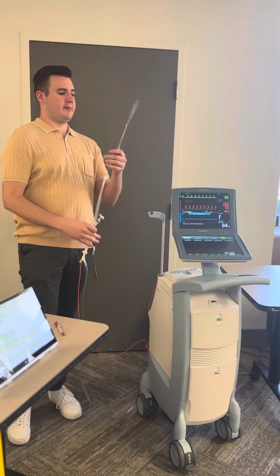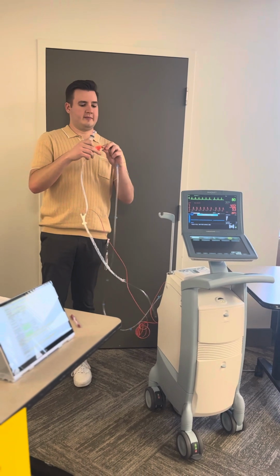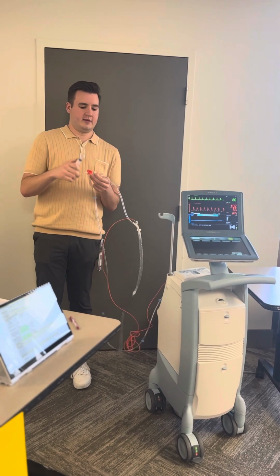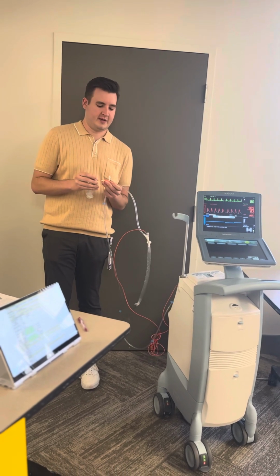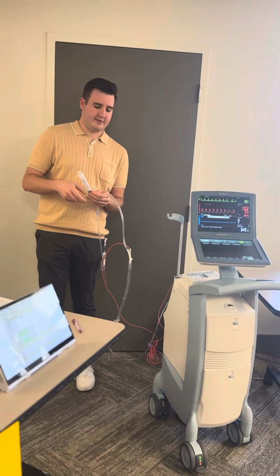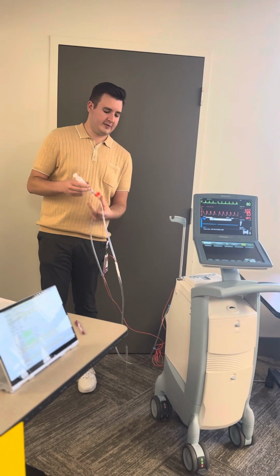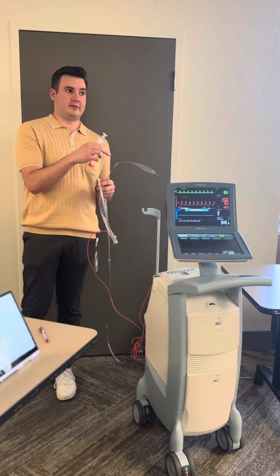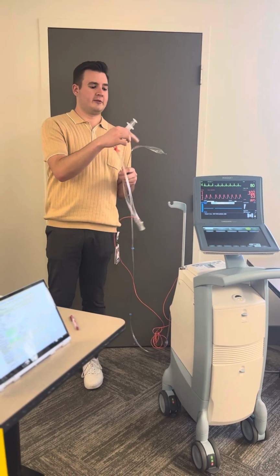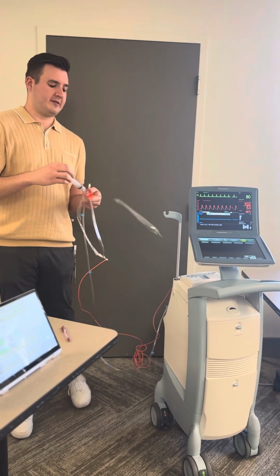This balloon is run by helium, and the clear tubing's the helium. You disconnect from that. And this is all built into the policy, so this is only emergency stuff. What you do first is pull back on the balloon, and you're looking for any blood in the tubing. If there's blood in the tubing, it means your balloon ruptured, and that's what the problem is, because there should only be gas in the balloon, no blood or fluid at all. So there's no blood, so you're good.